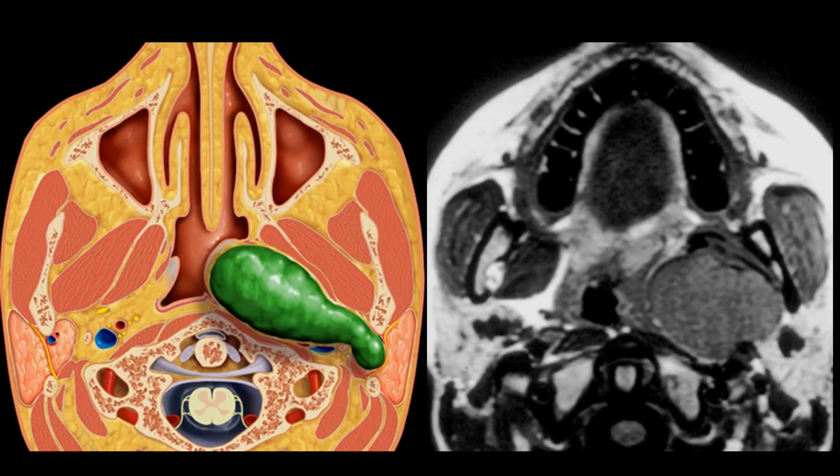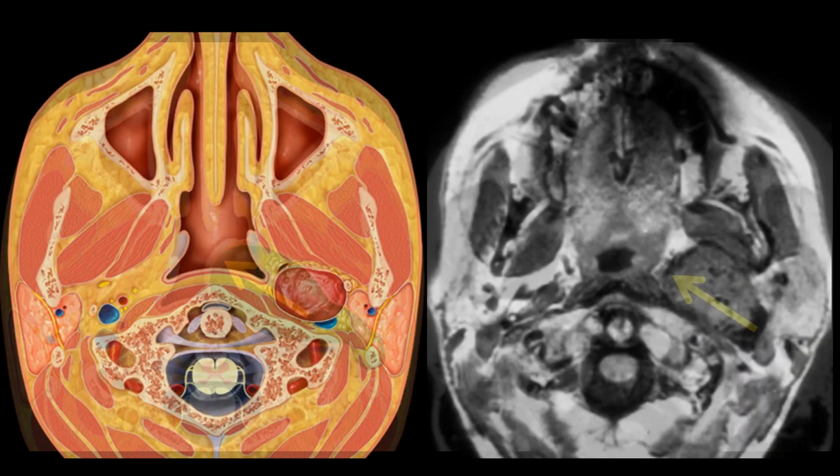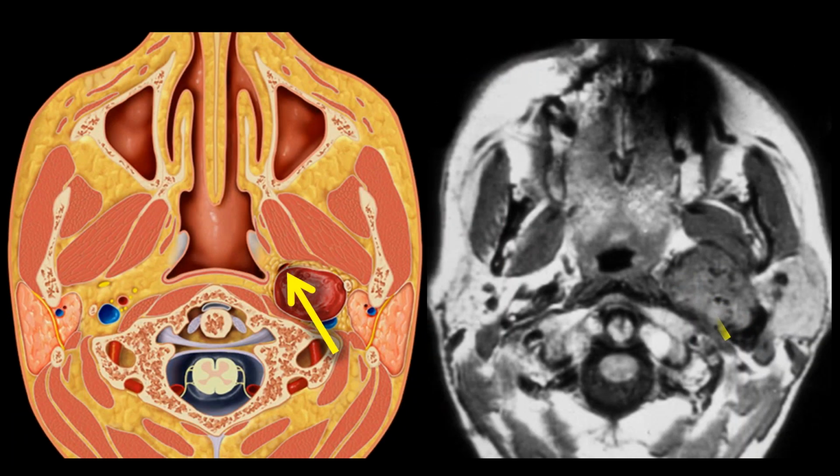If I have a lesion of the parotid space, I see that fat is pushed medially and anteriorly, helping me guess that this lesion is arising from the parotid space. And if I have a lesion arising from the carotid sheath or the carotid space, I see how that fat is pushed anteriorly. So I can think about the origin site of pathology and then make a space-specific origin, and then I can make an imaging differential based on those imaging findings.